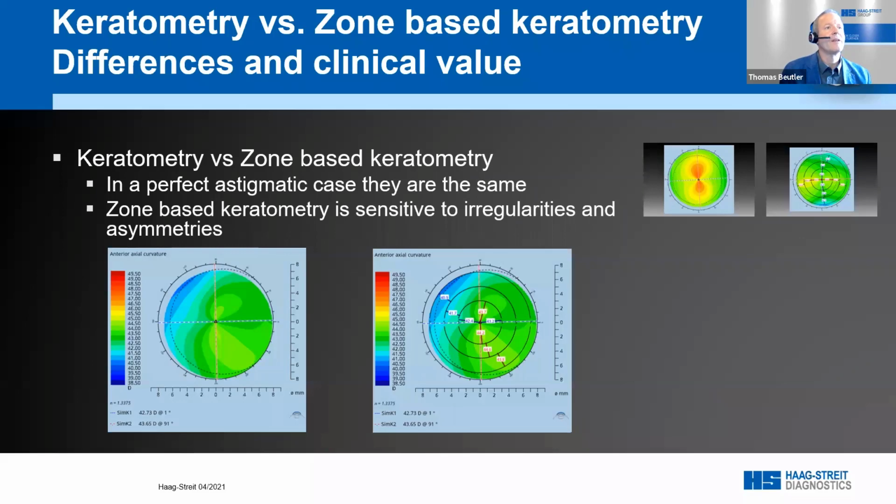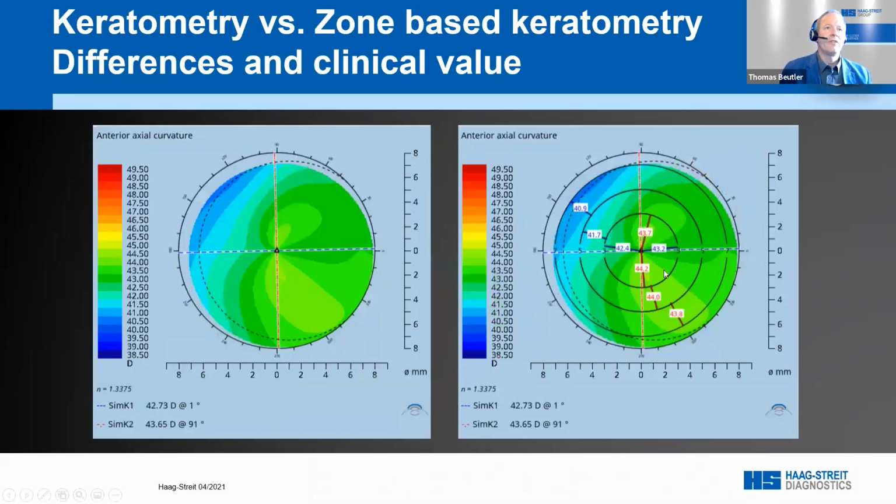we'll see that now we have in the zones even areas where we just have one steep area and a flat area, and we don't have 4 meridians any longer, but just 2 for flat area and steep area in the periphery, or also in the intermediate zone.